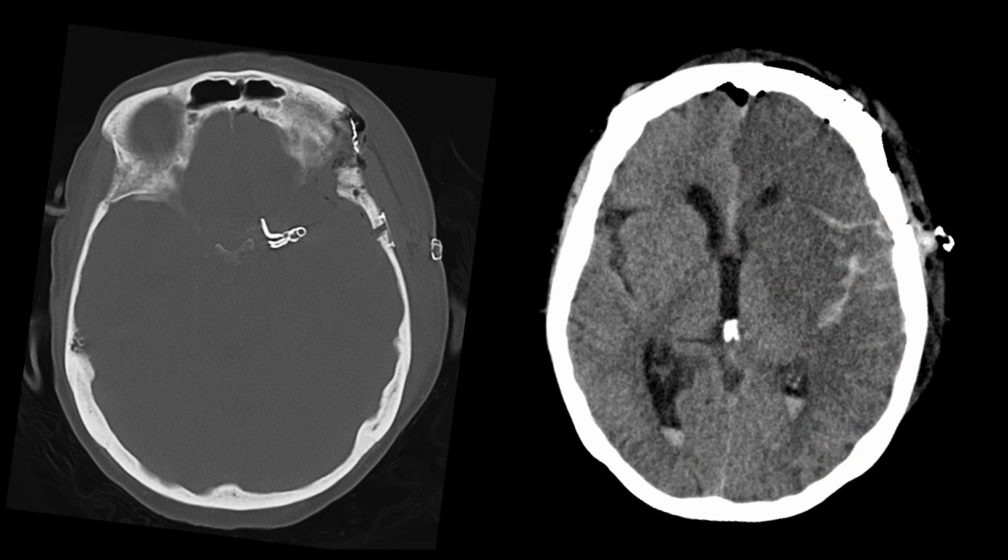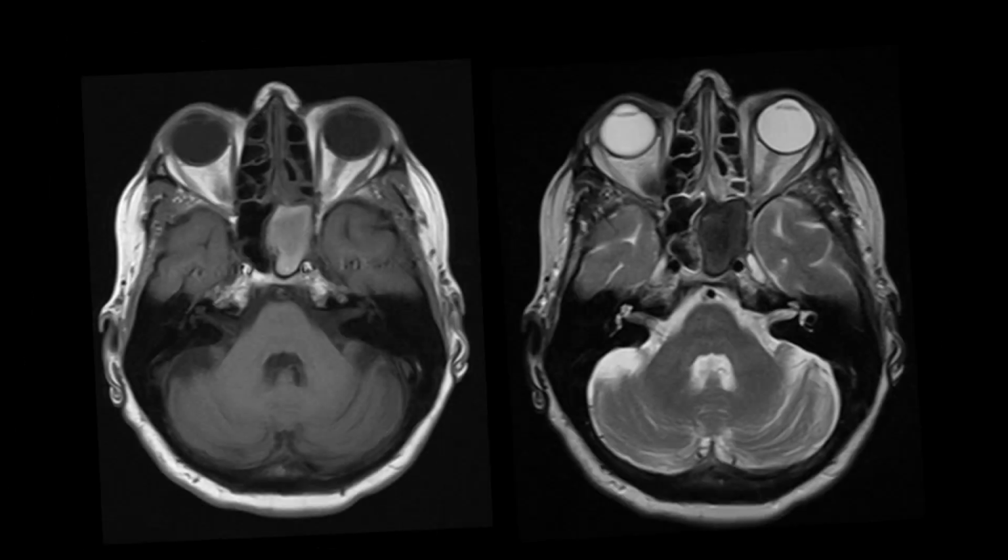And unfortunately, what we had missed on this patient was that on his MRI, he actually had complete opacification of his sphenoid air cell. Here's a pre-contrast T1 where we see very bright signal. We want to remember all the time, not a lot of things are bright on T1 before contrast, but we had a lot of bright signal here within that sphenoid sinus on the T1. Nose is dark, the nose knows, so this is before contrast, and it was very dark on the T2.